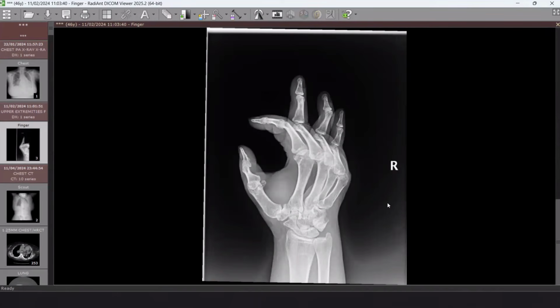I don't think we have any gross acrosteolysis really. Okay. But we have some sort of deformity. Do you know the name of this deformity? Because there is also a subluxation of the metacarpophalangeal joints. Yes, you are right. We have subluxation and we have flexion.